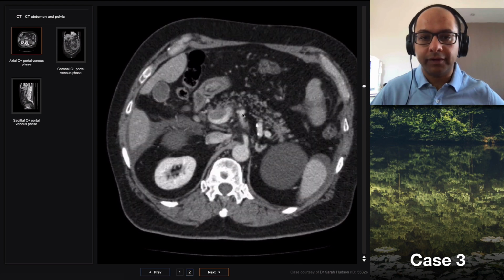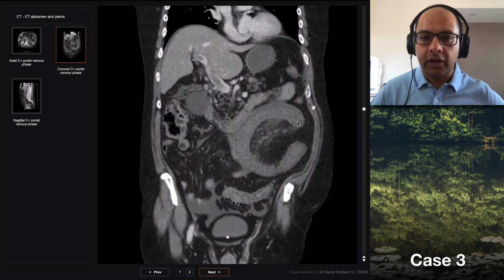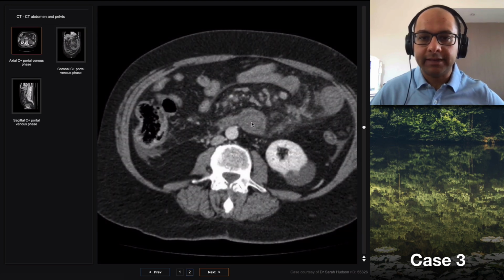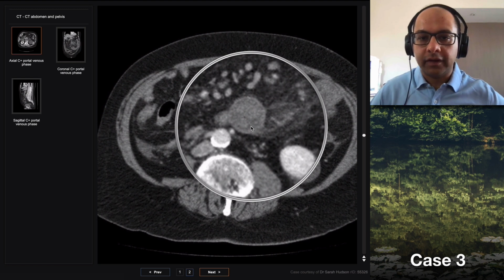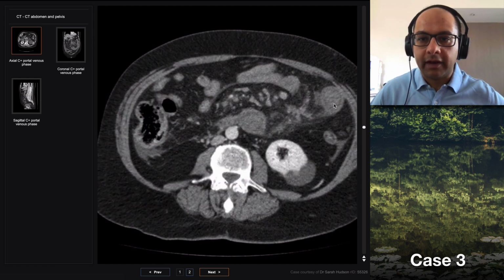mesentero-portal venous thrombosis. And then the consequence of that is this effect on the small bowel with quite a long length of small bowel, but particularly the proximal small bowel involved by the process. And the signs that we see specifically are, we see thickening of the wall to a much greater diameter than we normally see. And then in many places, we see this target-like pattern.